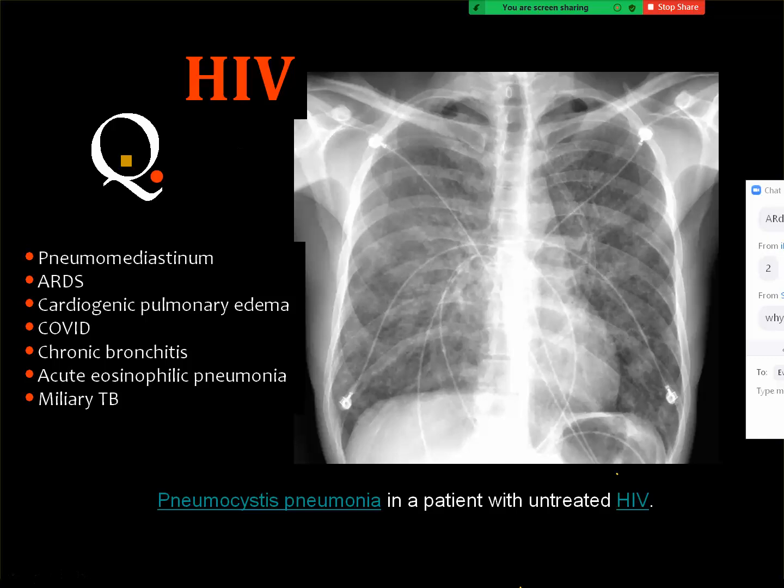Then the answer will be, why not COVID? Yes, the answer will be this type of pneumonia, pneumocystis pneumonia.